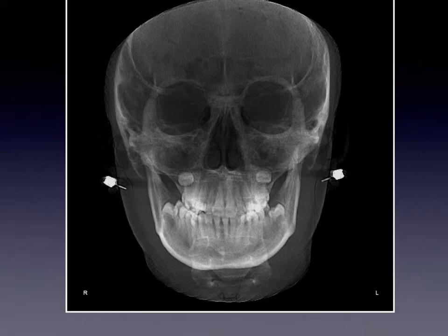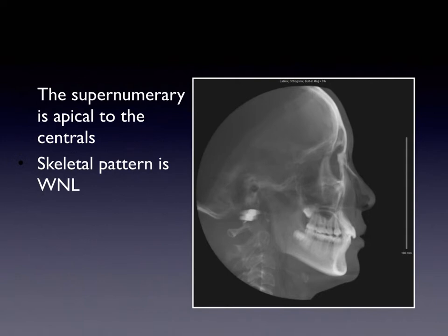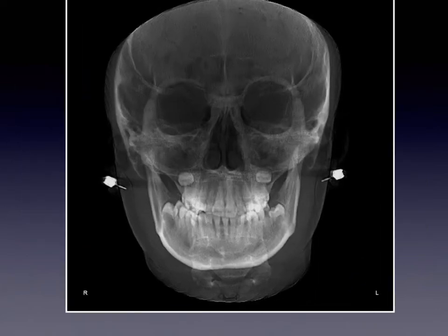And also you can see that the patient's jaw looks quite asymmetrical. The midline's off, the crossbite on the right side. Let's look back at the head film. We can't really see too much from the panoramic as far as the condylar position. So a good look at the condyle would have, I think, been good with this case.